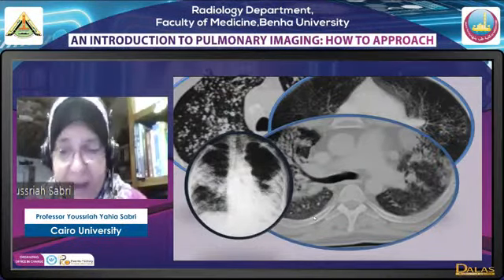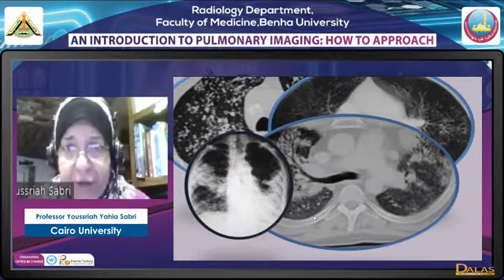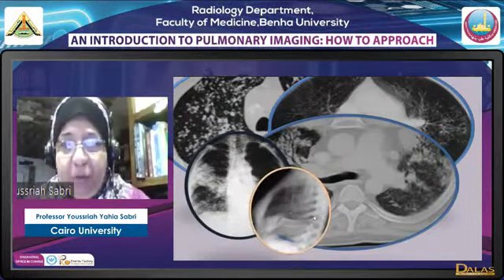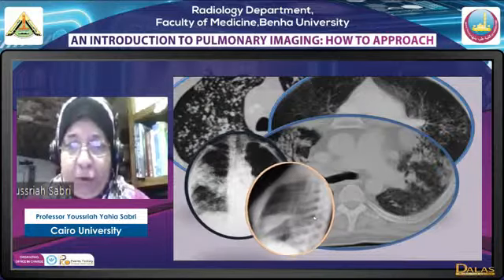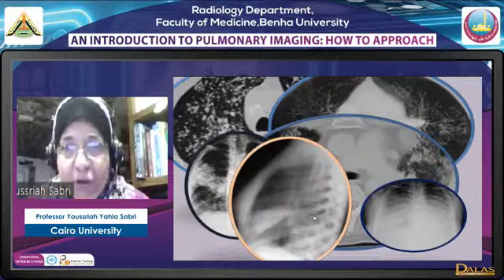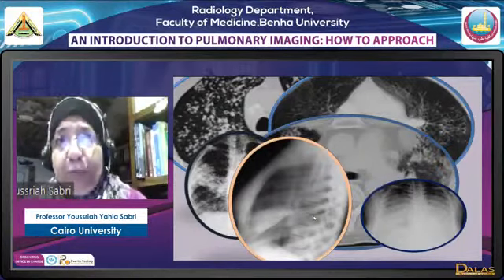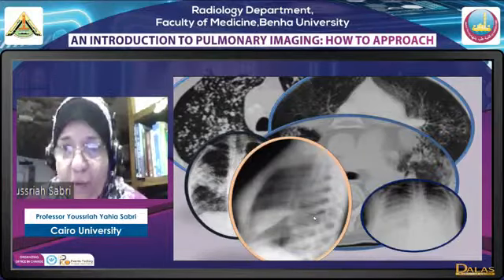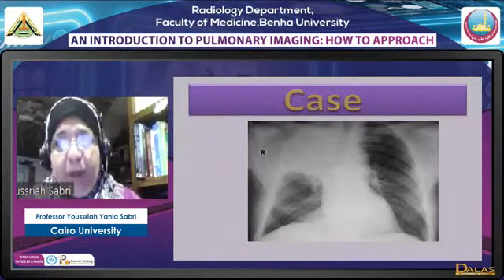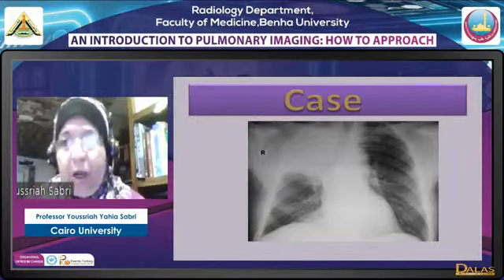Some malignancies may have this, simulating this appearance in cases of adenocarcinomas and lymphomas, etc. Sometimes. Anyway, the appearance, we may have a lobar distribution of consolidation. We may have diffuse bilateral distribution of consolidation. Now, to approach consolidation, we have to localize it, okay, and then we start to know what's the type, to have differential diagnosis. Now let us start by lobar assessment of consolidation, lobar appearance of consolidation.